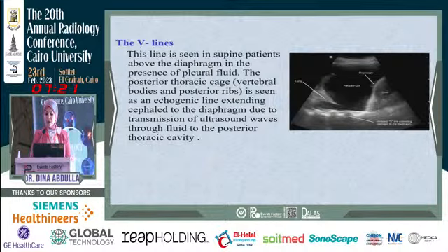Also, the presence of pneumothorax or mixture, we can see as in this patient. We will see hypoechoic pleural fluid and internal echogenic linear foci. We can also see air fluid level as in this image, the white arrow.